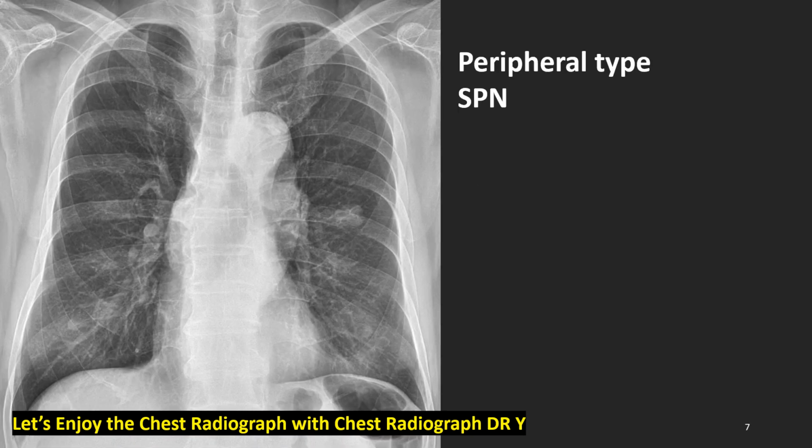Let's enjoy the pictures. This is the first case of large cell lung cancer. I think you remember this image. Yes, we met this image before. A 1.5 centimeter solitary nodule in the left middle lung zone. We do not know whether this is in the upper lobe or lower lobe because there is no silhouette sign applicable. Okay, solitary pulmonary nodule. For this patient, lung cancer is not good, and the cell type is large cell.